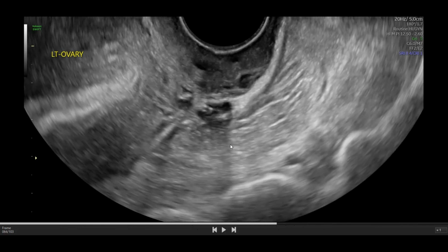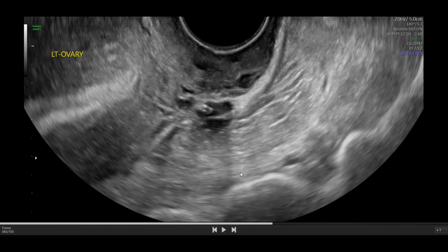but we should keep that in mind. And I don't know what these are here yet, but the other hypothesis, besides endometriosis, is that it could be physiologic changes with time. When the ovary ovulates, there is a trauma event. The ovary literally ruptures to spill an egg into the pelvis. And there's a breakage of the ovary surface, in which case there needs to be a repair. There's a tissue damage, tissue repair cycle that the ovary goes through. And as tissue does that, we do get healing processes, fibrosis, we get calcifications. Bright things are usually going to be a bit harder, more fibrotic, more calcified type tissues.